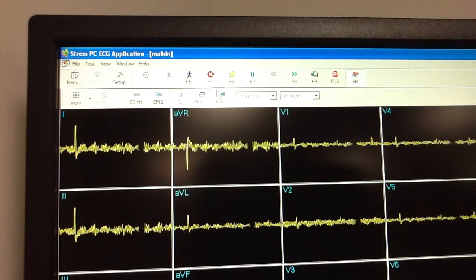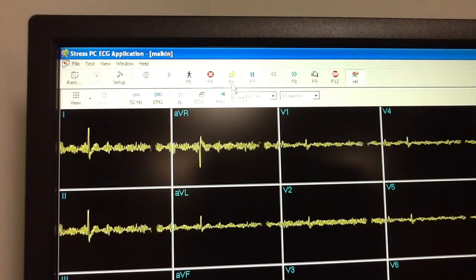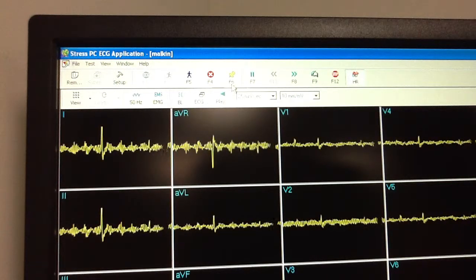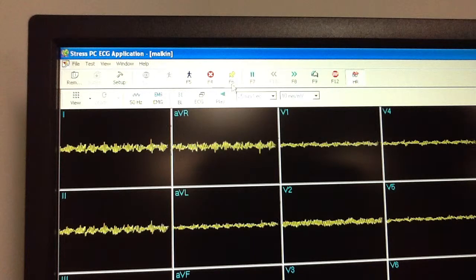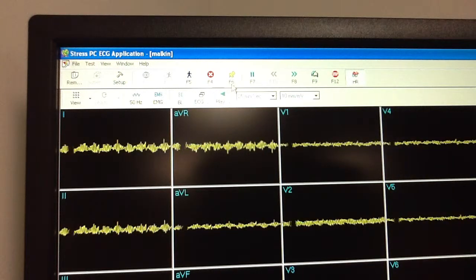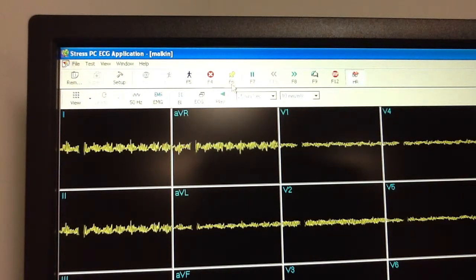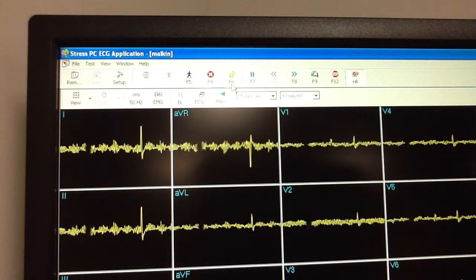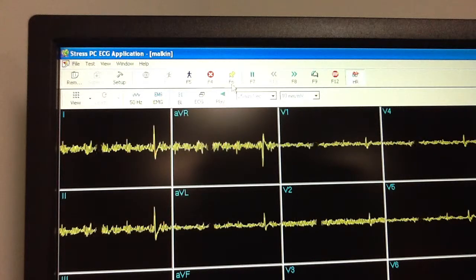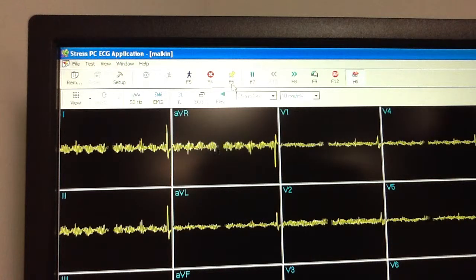Just to the right of F4 is going to be F6. And this button is going to set some events, and it can print according to the options when you press the button. So because this window appears very quickly, I may have to keep pressing F6 just to show you all the different things that we can do. So it stays open only for maybe 3 or 4 seconds. We'll go ahead and move forward with that.